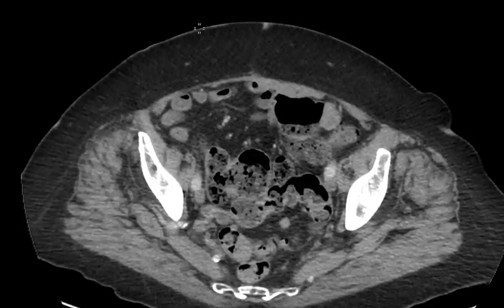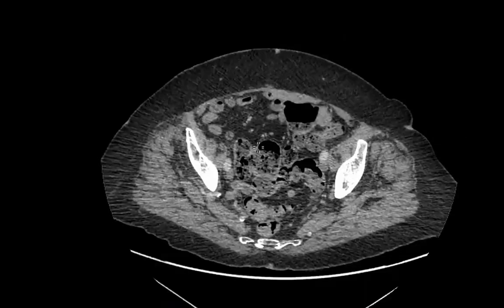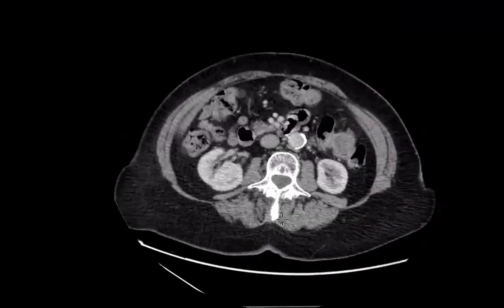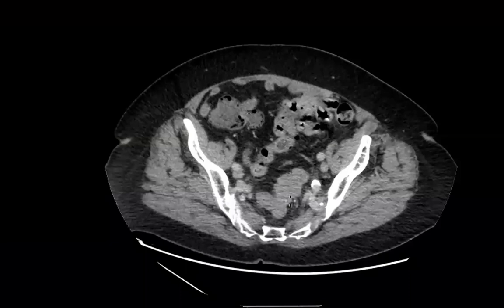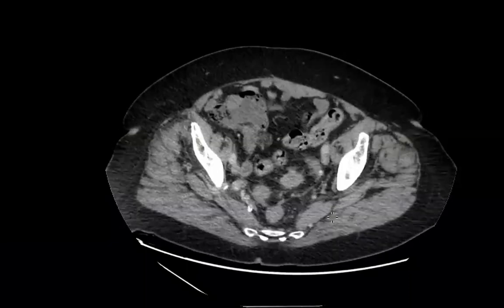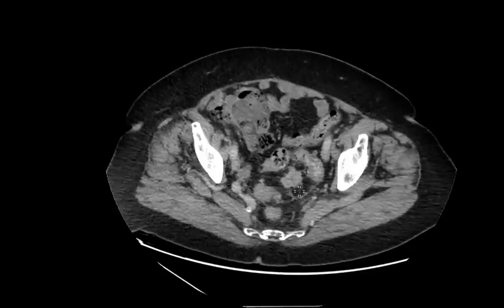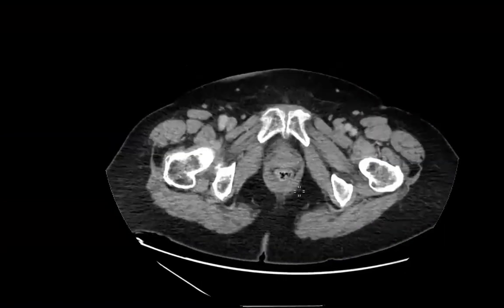I think it was a difficult case, but just to make you feel better, this case was missed in real life. All these cases today were missed by radiologists. So don't get disheartened. And this is the scan that happened after follow-up. Now it's bigger. You see this? Now, would you miss this one? No, definitely not. Would you be happy if I told you this also was missed? So this also was missed.